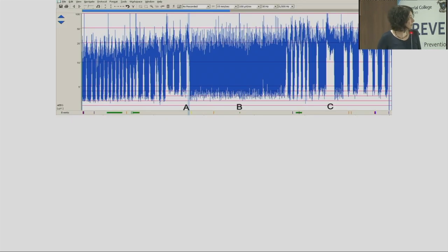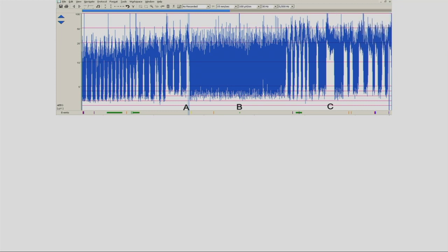And finally, the background activity. So here, this is below 5. So if we look at this, burst suppression pattern properly. It's below 5.